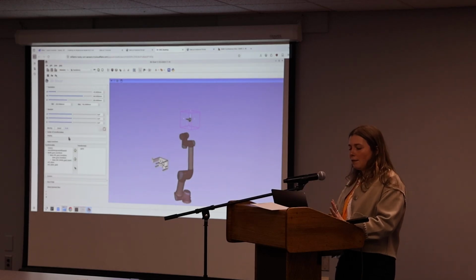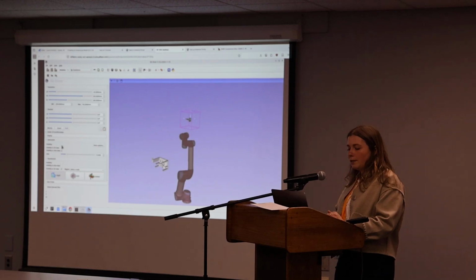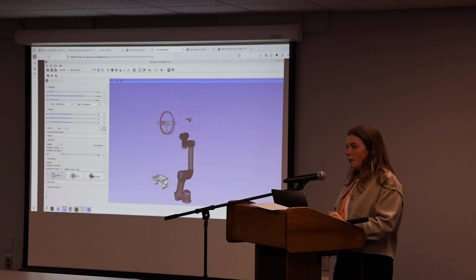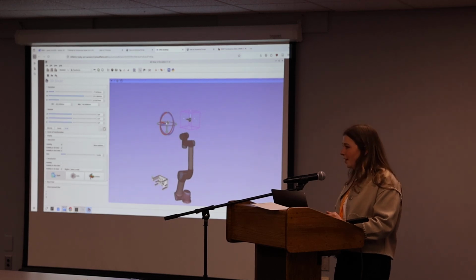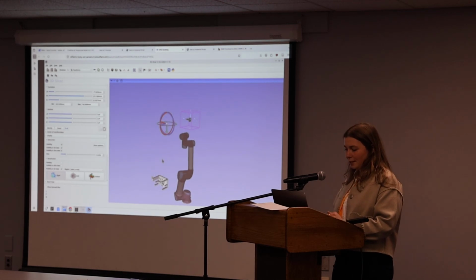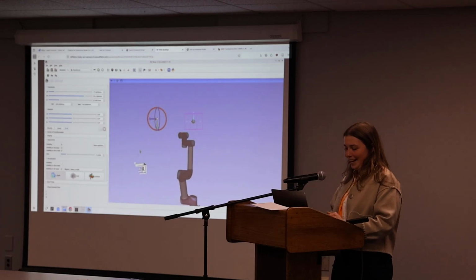And then the easiest way I find to interact with these transforms is to go into display and do visibility. You can do check here. Okay, some weird things are happening, but when you move this around in Slicer now, you should move the spine. Again, I don't know why things are lower than they are. Usually this is all in the box. So that's a bit of a weird symptom of this fast AI thing, but that's okay.